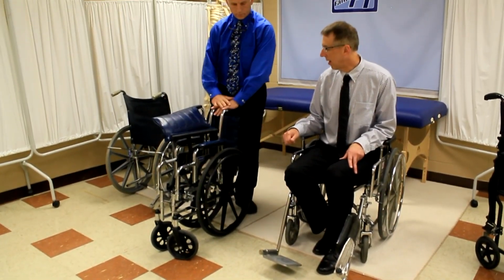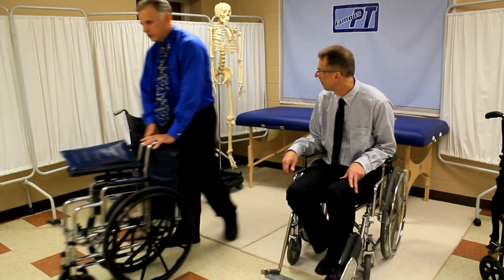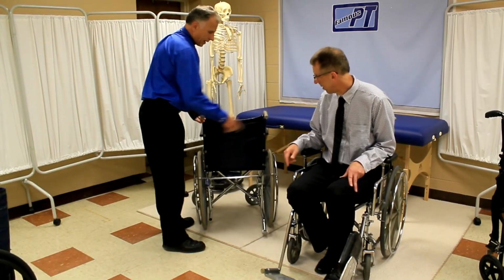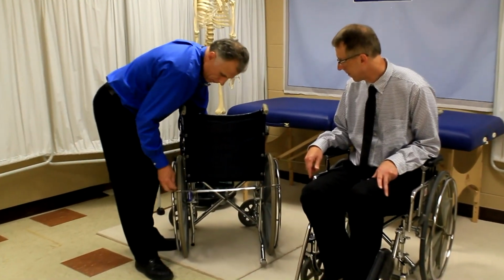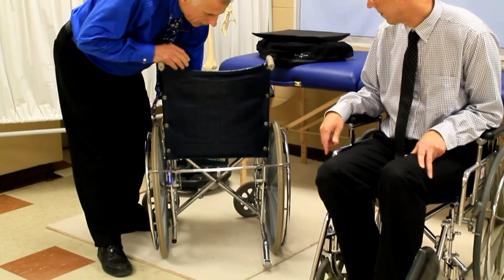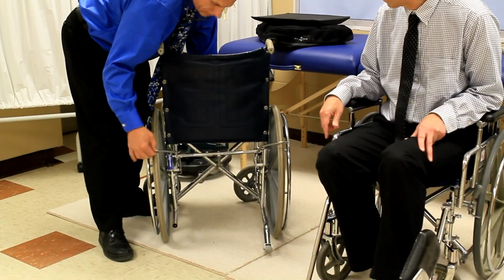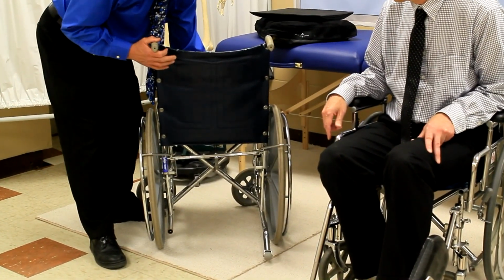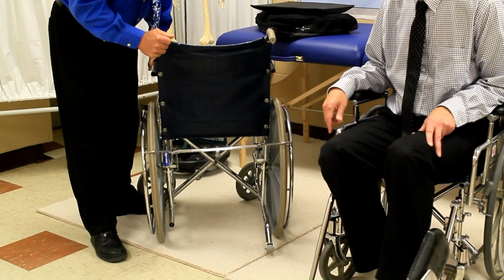Those are the things you want to, do we want to mention the self-locking brakes? Well, we might as well see how we're at it now. This is one style, and I like this style of self-locking brake, and if you can look right here, take this off, when you put weight on the seat pan, you can see how these elevate, and they take the resistance off the rubber of the wheel, and when you get off the chair, they come back down, and then the chair cannot go backwards particularly.